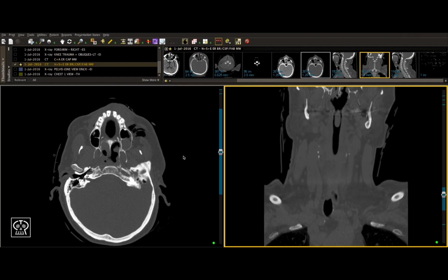As you can tell, sometimes it'll be a little bit easier to see a fracture, in this case on the left lateral side, but other times it can be very challenging, as shown on the medial pterygoid plate of this example. Always look at your axial and coronal views, as it will give you the most information and give you the best possible chance of diagnosing these fractures.